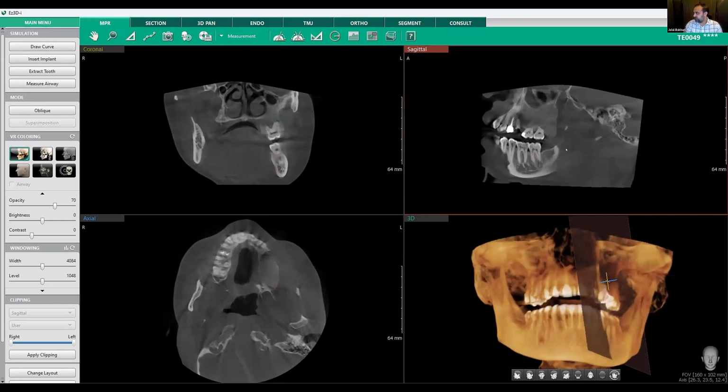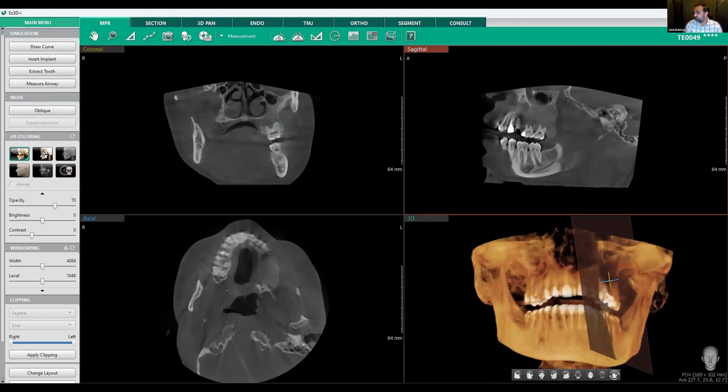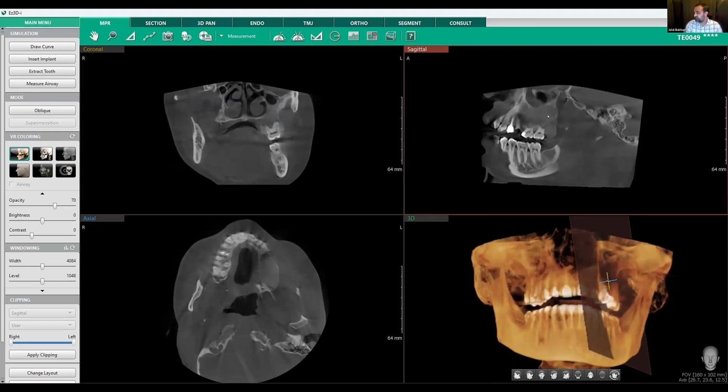Now it's time to scroll through. So again, we can see a well-delineated area in the left posterior maxilla where the internal contents of this area of interest is granular. Now, this is a great case to show granular internal content, as mentioned by Dr. Biccolini before.